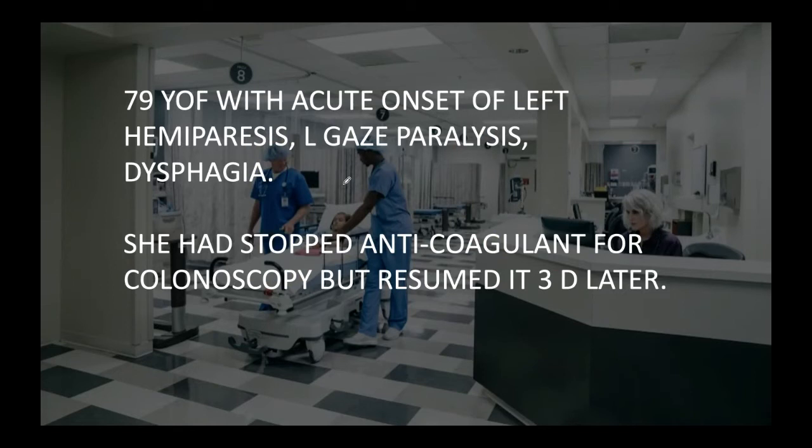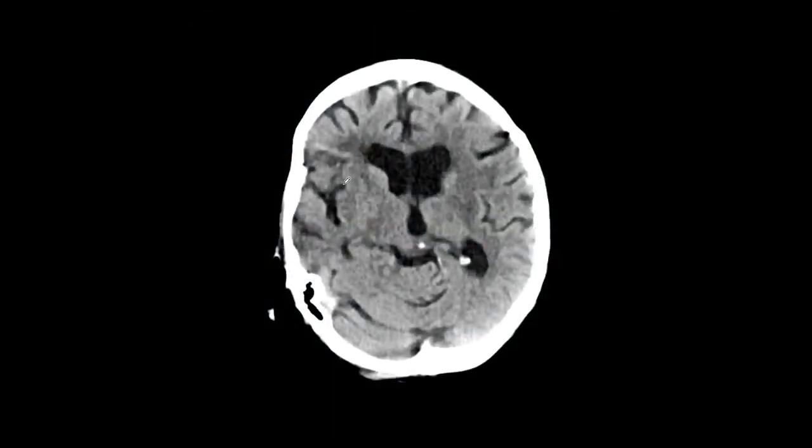So this is the next patient, a 79-year-old female with acute onset of left hemiparesis, left gaze paralysis, and dysphagia. She stopped anticoagulation for colonoscopy but resumed it in 3 days. This was the pertinent history. This is what we see. So when compared to the right, I do see mild decrease in density. Is it real? Is it not real? Something for me to consider, right?